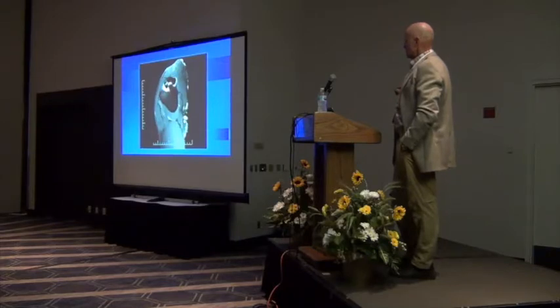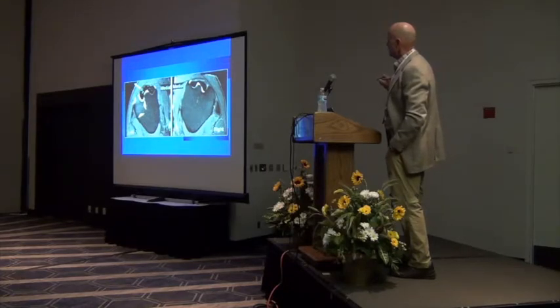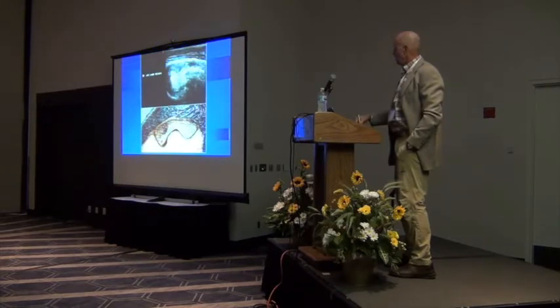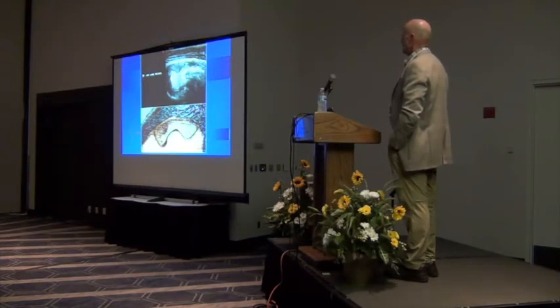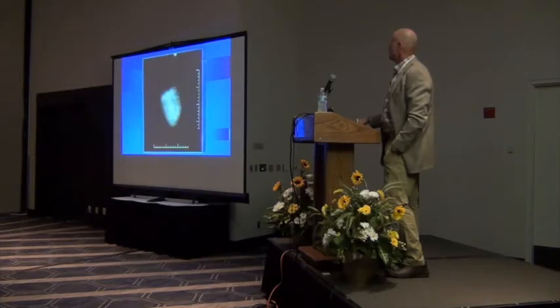So see, this is a fat sat PD, and there's a bone reaction underneath that lateral lobe. So there's certainly, obviously, probably some bone pain that goes along with it. And that's just showing you what we were talking about earlier, more fluid in the bursa as well as bone edema in that shaft of the humerus underneath the greater tubercle. This is what it looked like on ultrasound. So these opportunities are great. That's what that MRI of the lateral lobe looked like, and that's what it looks like on gross. So kind of a nice representation of a tendon injury in a horse that gives us all those modes to look at.